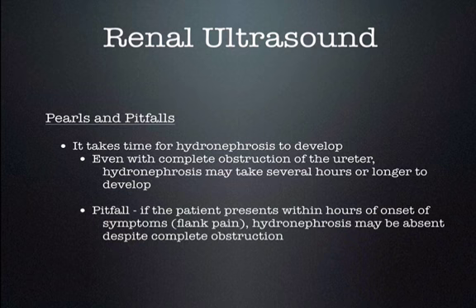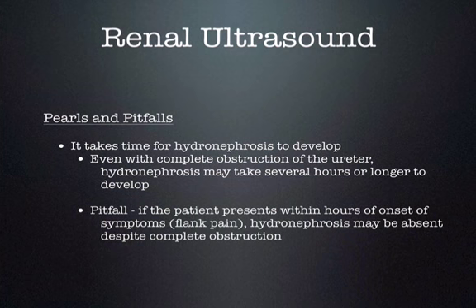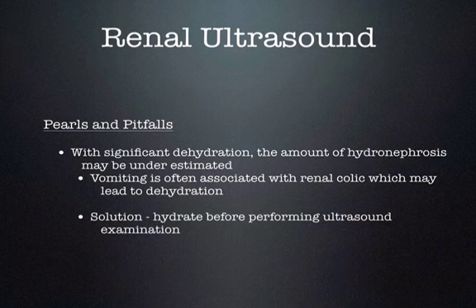Let's now talk about a few pearls and pitfalls when performing the renal point-of-care ultrasound. As mentioned earlier, it does take time for hydronephrosis to develop. Thus, even in patients with a complete obstruction, if presenting early enough, the ultrasound may be negative for hydronephrosis. Make sure you adequately hydrate patients prior to performing the ultrasound, especially if there is associated vomiting or diarrhea with the flank pain. With significant dehydration, the amount of hydronephrosis may be underestimated.